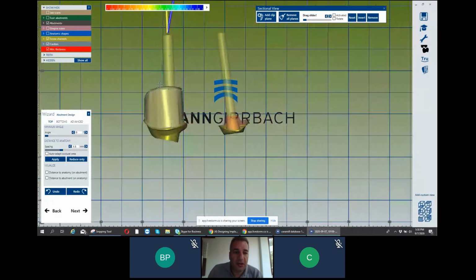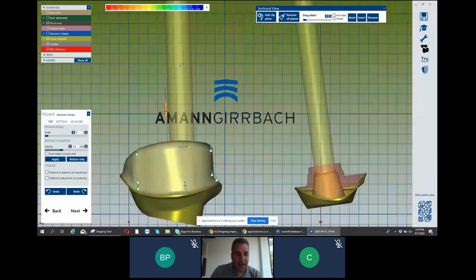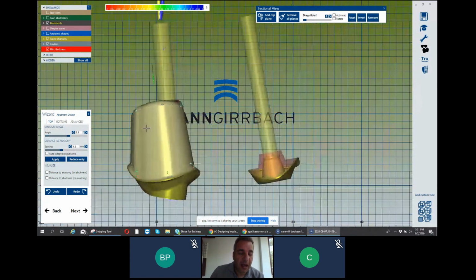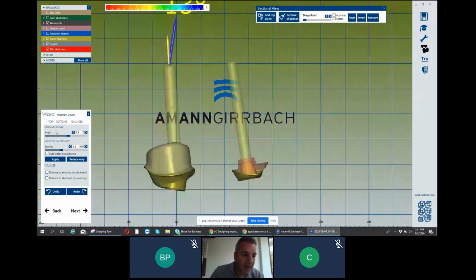If you have short crowns, you need angle 0 for retention. When you have anterior teeth and you have big crowns, it's better to go for an angle for retention, like cups. So for us, undo, here. So we have the angle.